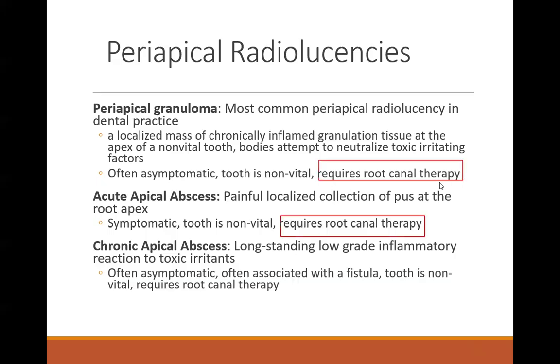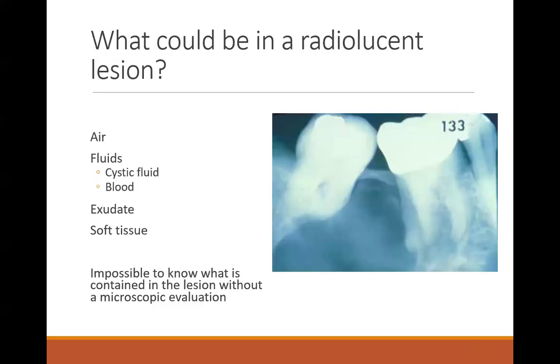So it requires root canal, requires root canal, requires root canal. Generally, any kind of an abscess ends up needing a root canal, or like I said earlier, if the person doesn't want that, then an extraction.